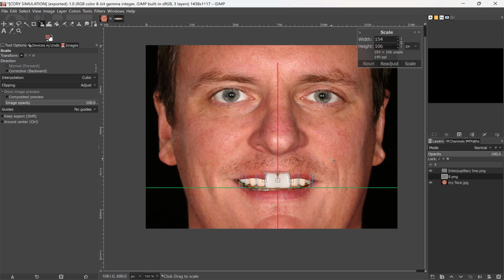So that's probably plenty enough to bog most of you down for this video. So I'll quit with that. Probably have no business making the video this early in my use of this program, but again, you can figure it out. So I hope you found that useful.